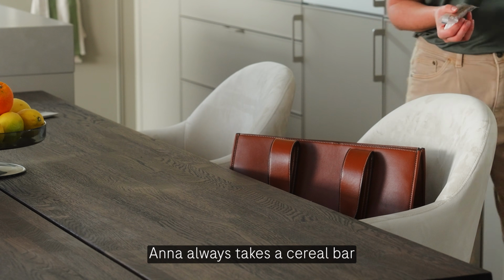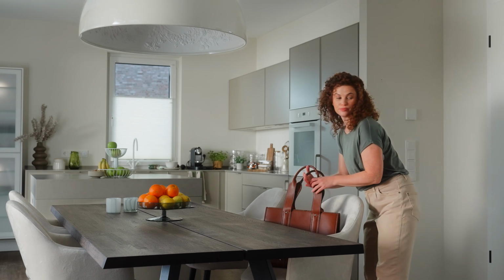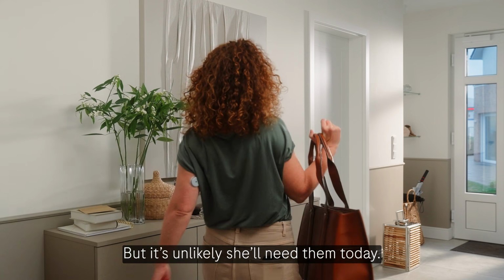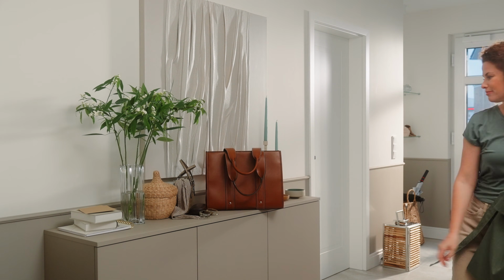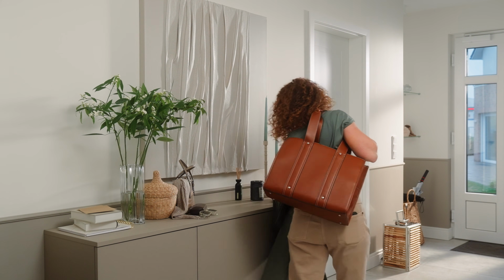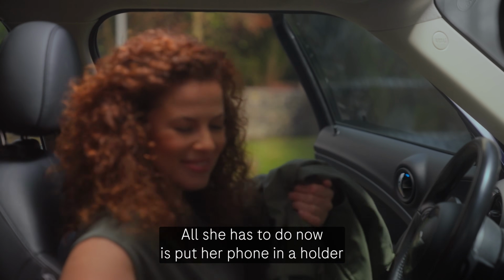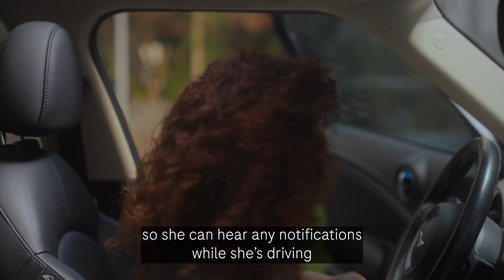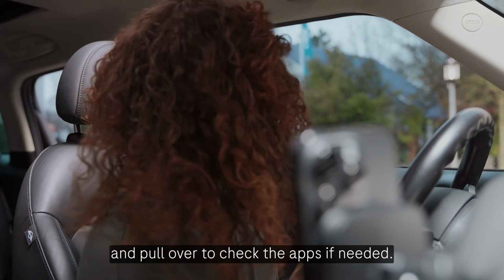Anna always takes a cereal bar and some glucose tablets with her on long journeys, but it's unlikely she'll need them today. All she has to do now is put her phone in a holder so she can hear any notifications while she's driving, and pull over to check the apps if needed.